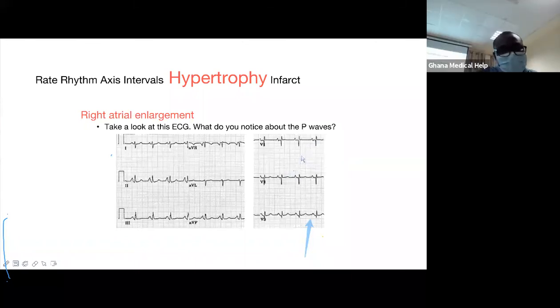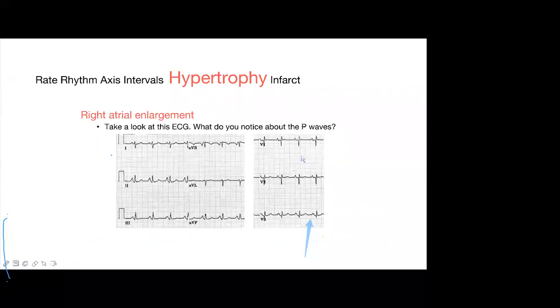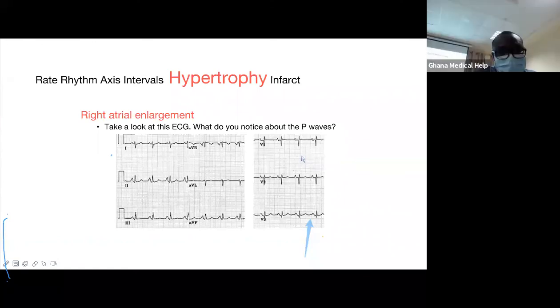Now, if you say they are bifid, bifid means two angles. There is one side and the other side. Look at the various sides. Which side is bigger? Is it the one going up or the one going down? This is what it means by bifid. If you trace this, you see that it goes up, goes down, comes back. So which one is of a bigger depression or elevation? Is it the one going up or the one coming down? Fantastic. So it is the one going up.